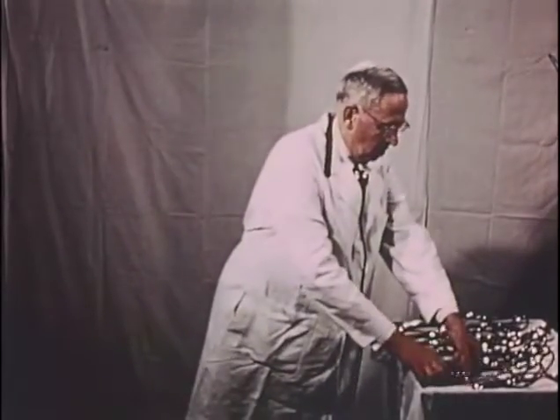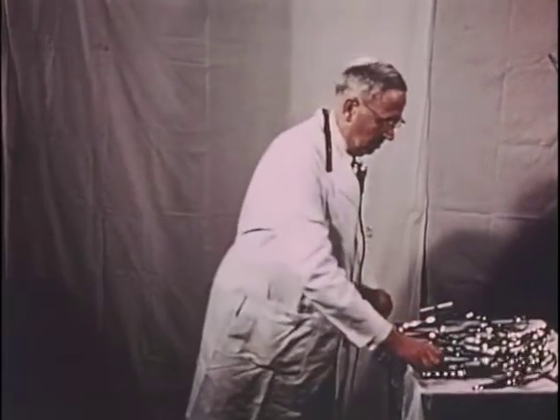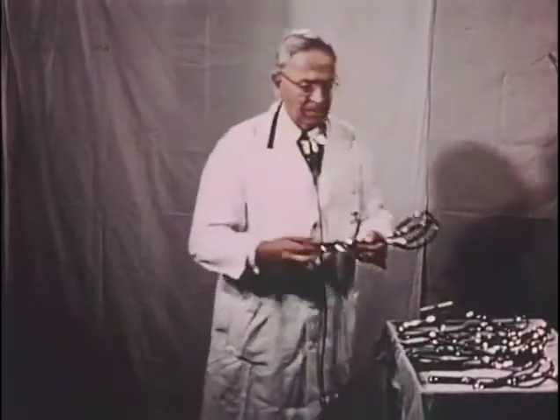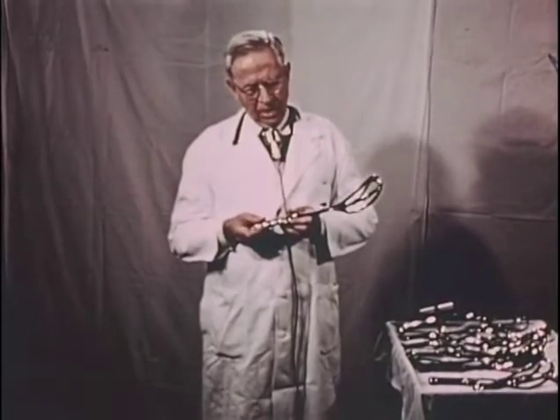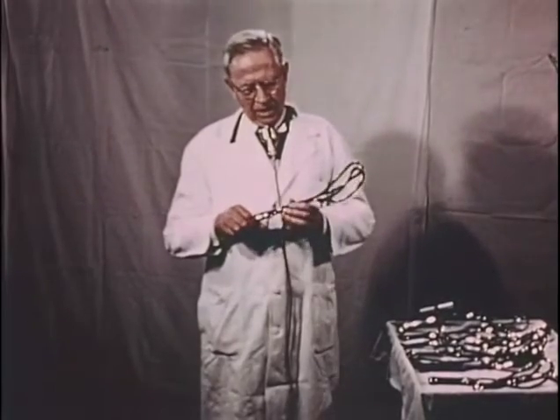The shanks are either overlapping or they are separated. At the junction of the shanks with the handle is the lock. Originally, there was no lock to the instrument. Then it went through various stages of development to a fixed lock, semi-fixed lock, set screw lock, swivel bar lock, and then the pendulum swung to a sliding lock.